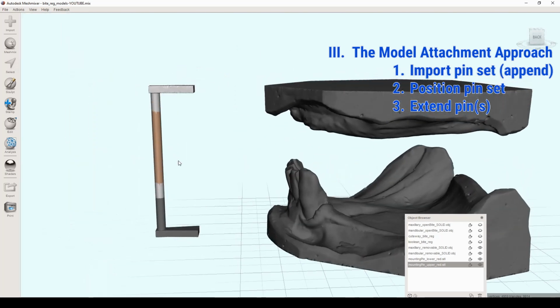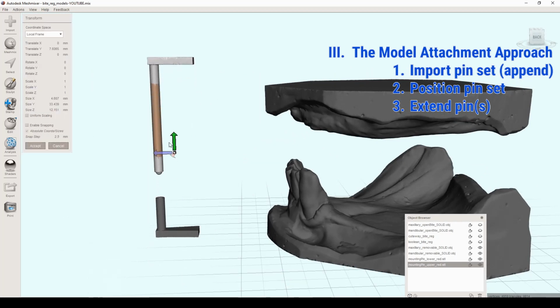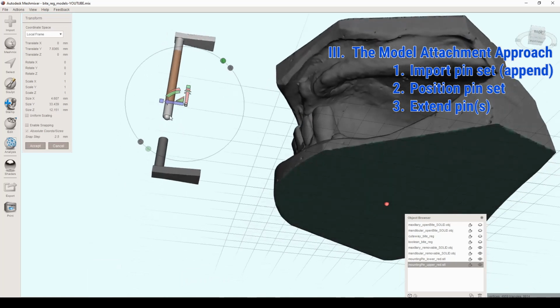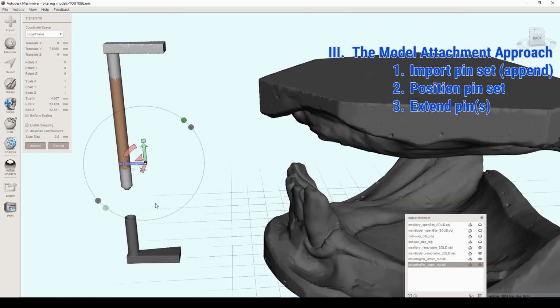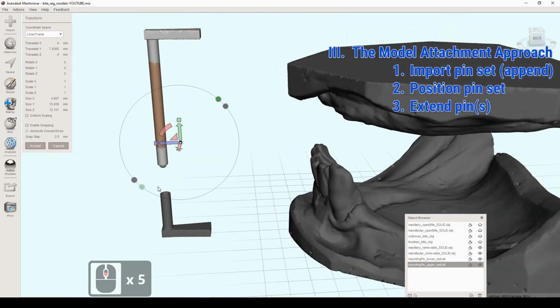And let me show you what this interface looks like, because this is 2 separate things. You have this bottom piece here, and then you have this top piece. So if I just quickly and temporarily bring this up, you will see that there's like a little circle there that will fit into a little dimple, and that will kind of articulate together. But it's so important that these stay in the exact orientation that they're in while you're attaching them to the model.